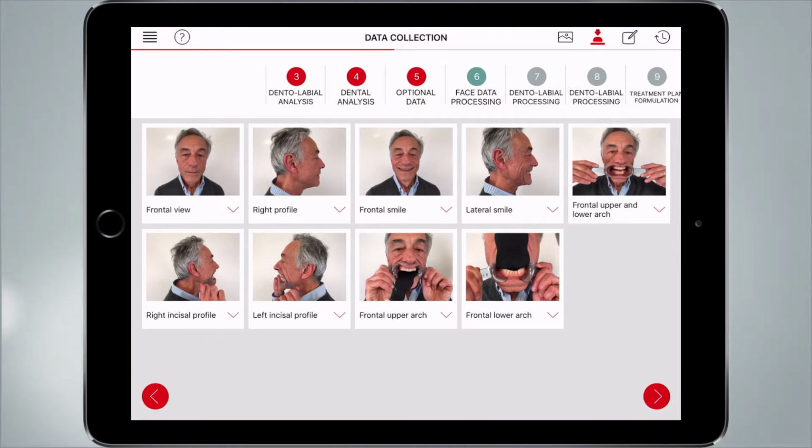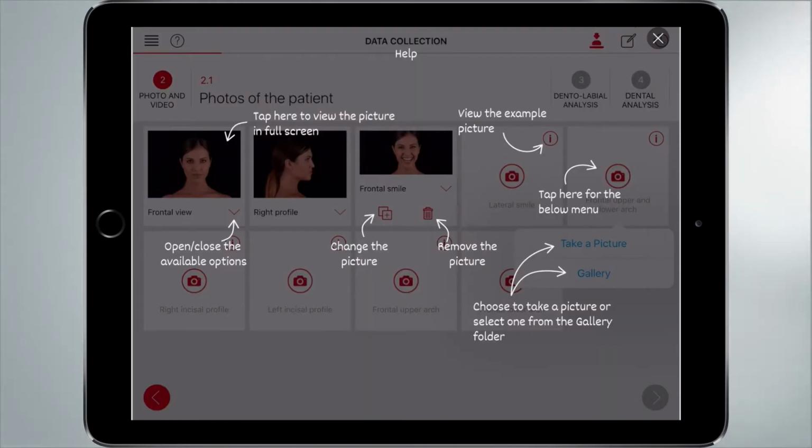But you can go back and have also other information. For example, on the left side, same line, you have a question mark, upper on the left side. And when you push this button, you can find all the explanations: how to move your hands, how to use the button, how to use all these examples. So it helps the practitioner in a very, very good way.